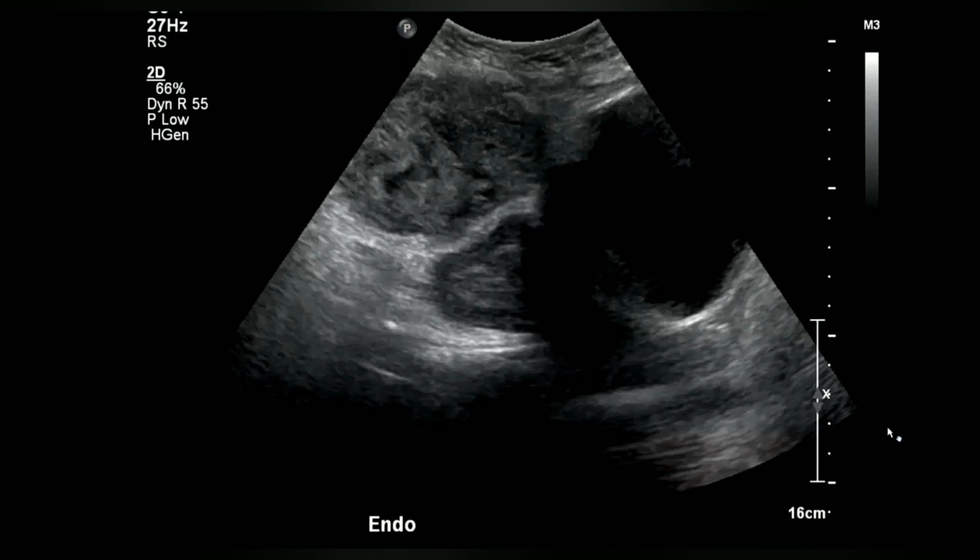Ma'am, first of all, I was thinking of AV malformation, and it can be a hyperechoic area close to the, can be a hematoma formation. Okay, good. And what else could it be? Ma'am, can it be scar? She's recent postpartum, she is just within 40 days, she's not too far away. So the scar period hasn't come yet for her. Okay. So what do you want to do next? Next, MR. You'll do an MR.